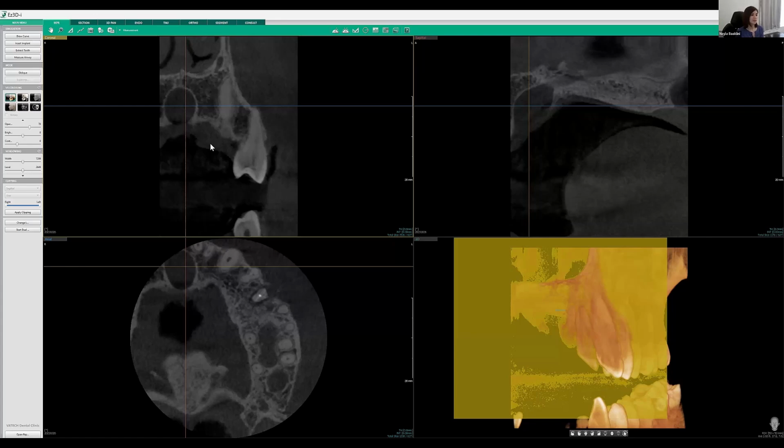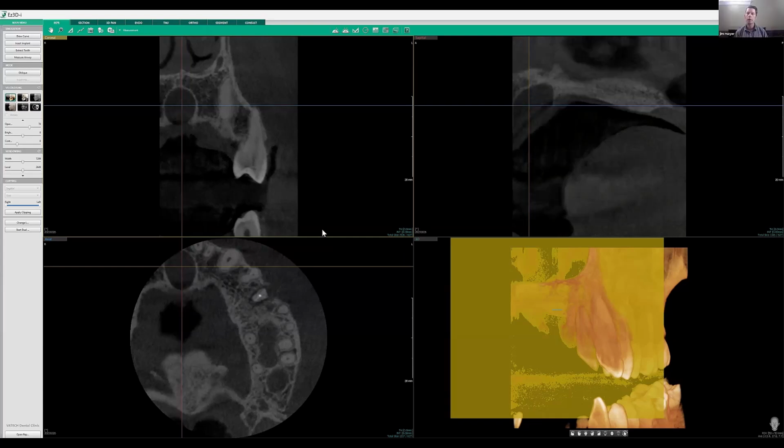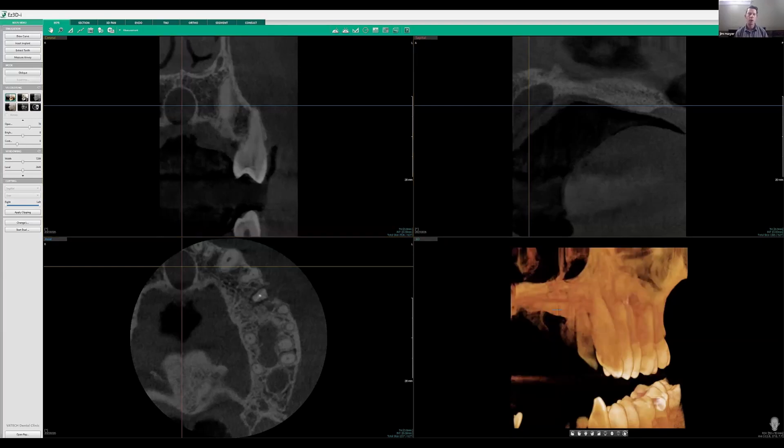We're going to go through these details a little bit more in depth in the next sections, but I want to focus on these terms right now: uniform expansion, uniform thinning, hydraulic expansion, which all can indicate a cystic growth. We've just reviewed 2 cases, going from a larger field of view looking at 21, 22, to a smaller field of view looking at that incisive canal and that tooth number 13.